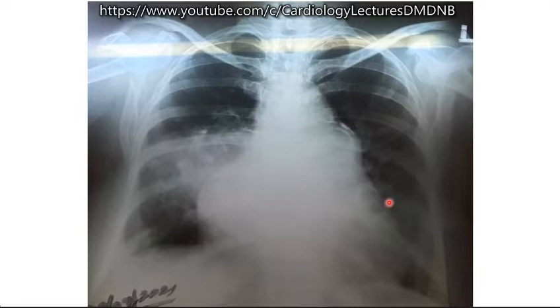The only explanation is that in a patient with pulmonary artery hypertension, some of these patients can develop some degree of tricuspid regurgitation, and it may be secondary to the tricuspid regurgitation that the patient might have developed right atrial enlargement. I agree with you that mostly it is left atrium, but I also felt that there is a right atrial enlargement. So that's the way you should discuss.